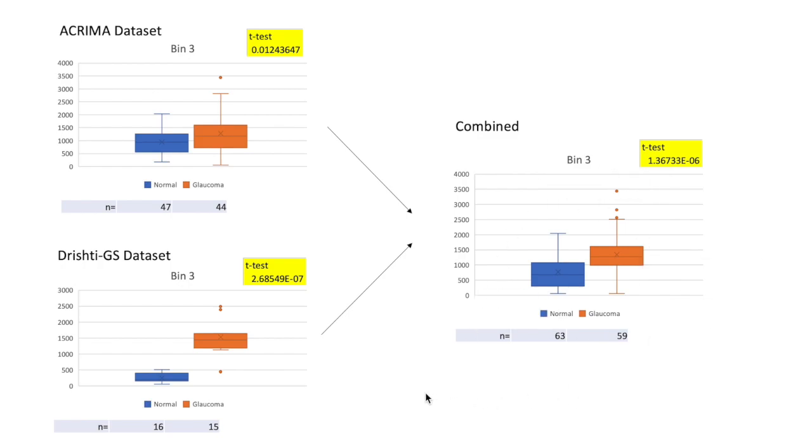And I'd like to point out here that if you look at the scatter of the glaucoma patients, this is suggestive that we will be able to find substages using shape features such as the one that I measured in this presentation. Now, I'm not a glaucoma expert, nor am I an ophthalmologist, and so I cannot assess the labeling accuracy of the archived data.